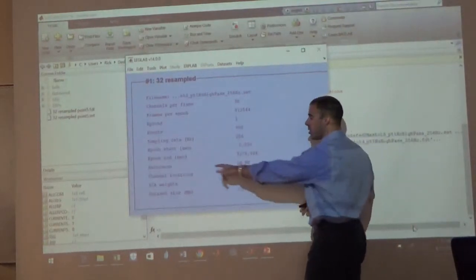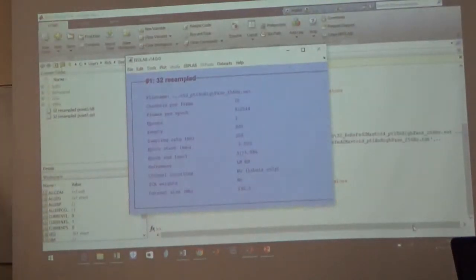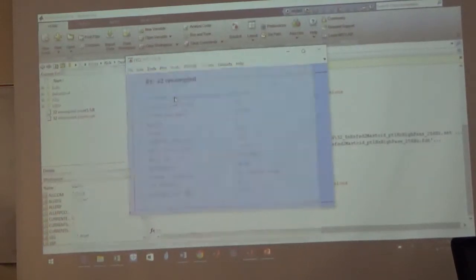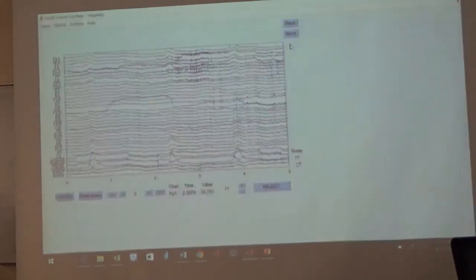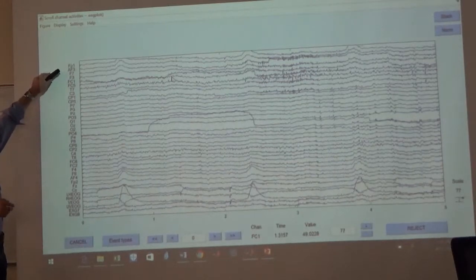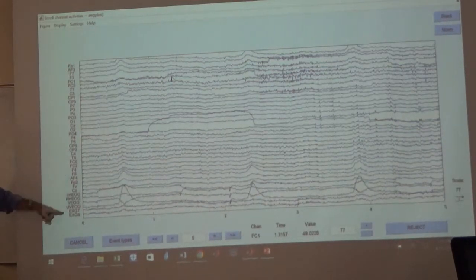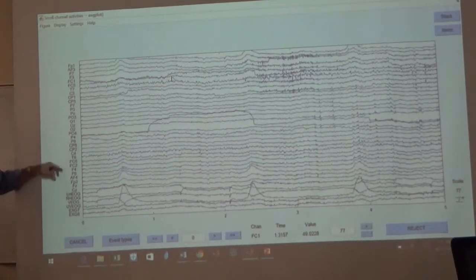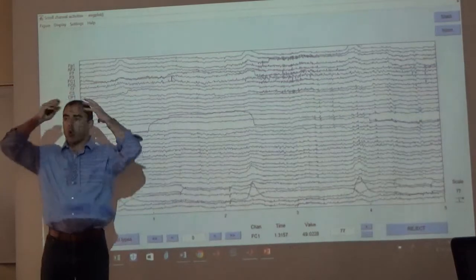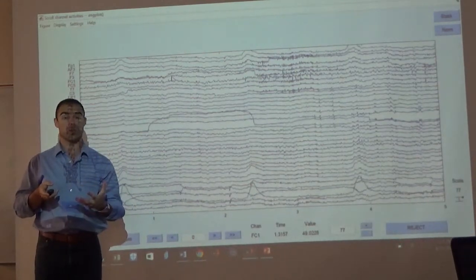It tells us one thing right off the bat, that we do not have channel locations labeled. So let me just show you a little bit about what that might mean for us. Let's go to plot channel data scroll. We'll bring up the data. We can see that it tells us all these features of each of these EEG traces, of what site they're from. You remember we labeled the VEOG and we labeled the HEOGs. It tells us the names of all these sites, but the computer system does not yet know the coordinates on the scalp that they are actually at. So the first thing we're going to do is load channel location information. I'll show you how to do that.